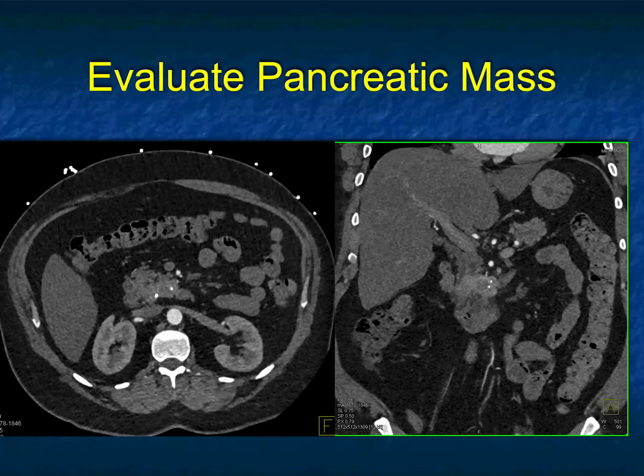Pancreatic mass. Well, this is a good case. There's a mass in the uncinate process that's solid density with 2 punctate calcifications. Could this be adenocarcinoma? I guess so, but it's more solid than the rest of the tissue. It's not very vascular, but it's brighter, denser than the rest of the tissue, and it has calcification.